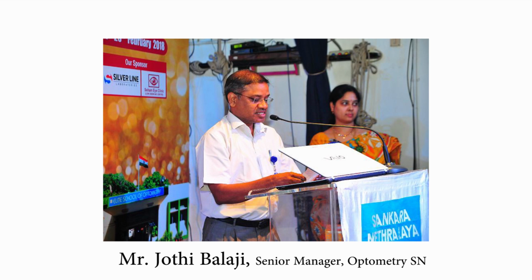What is very interesting is when we categorize, there are 3 major classifications. One is blink or fixation related. The second is a projection related artifact, because the myopic eye has early vitreous changes. These vitreous changes cause some shadowing.